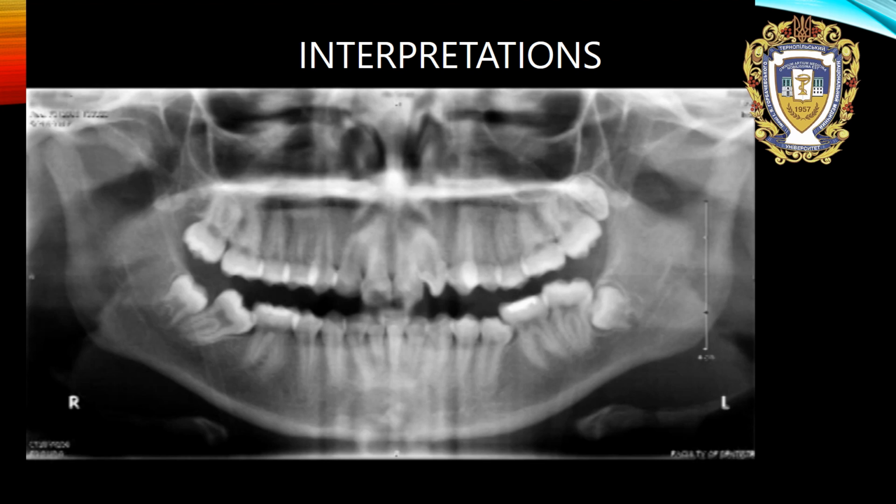Nonetheless, any visible positive findings must be identified. These structures should be viewed in a systematic manner, examining the posterior teeth of the first quadrant to the posterior of the fourth quadrant in a clockwise direction.